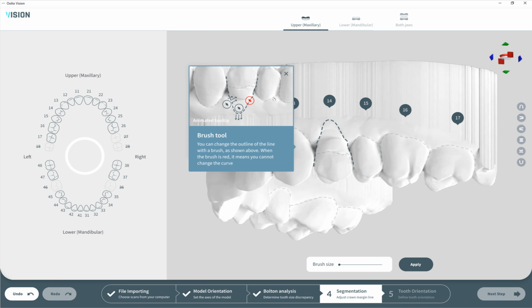you will have a circle around your cursor, and by clicking you can shift and move this curve nicely inside and outside. And when you're hovering your mouse over the line, it becomes red, meaning that you cannot do anything with that. It's not like in other software, it's some fancy idea of how it might work. We are not sure it will be implemented in the final version, but we find it very handy and nice. And of course, you can change the brush size.